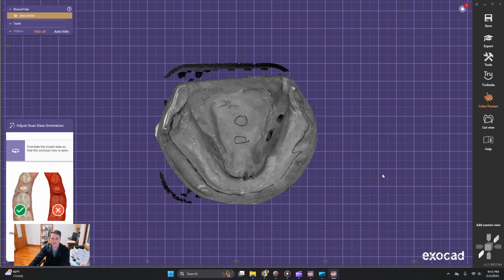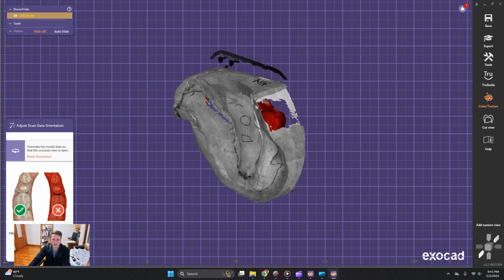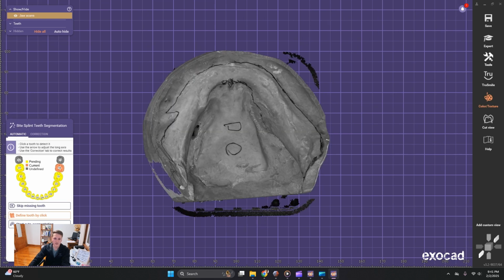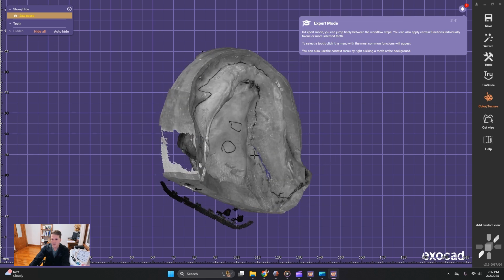and here we go. Just go through the process again. Then when you're done, both the upper and lower tray are going to be in the same folder that you started out with for CAD data. The only other thing too for this model, if you can kind of see here, there's a hole. So if you need to fix that, just like how we cut the tray that was overhanging and we fixed that hole, you would do it the exact same way.